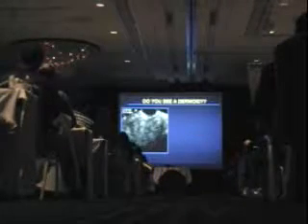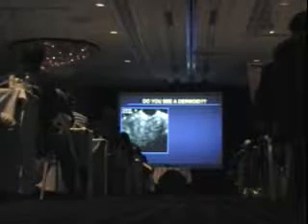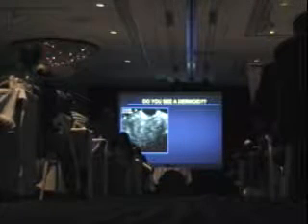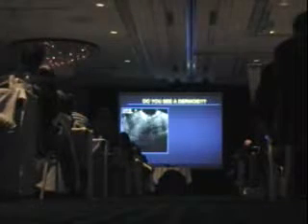Some people have termed that the spaghetti sign, another feature that we sometimes see with dermoids. And here, if you have a patient that has a, quote, mass palpable and you don't see it, and you've done abdominal and vaginal scan, you don't see one of the ovaries either, think about a dermoid. And clips can sometimes help.